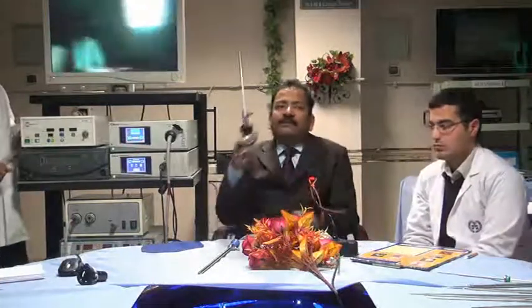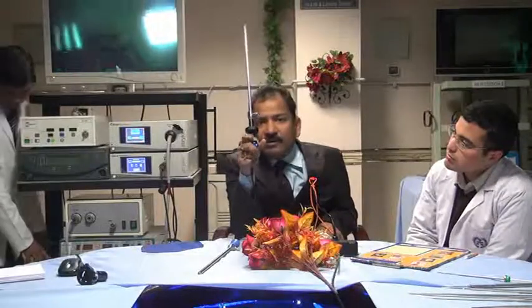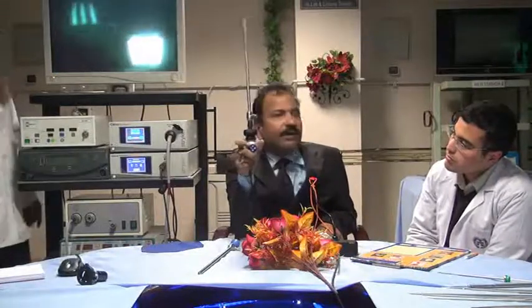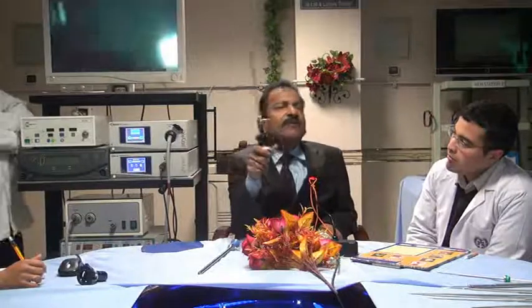These are the 4 buttons, but don't worry, I am going to demonstrate them. These buttons are programmable buttons. You can program them according to your need. Some pictures, all can be programmed. How to program, I am going to demonstrate. So just within a few minutes.